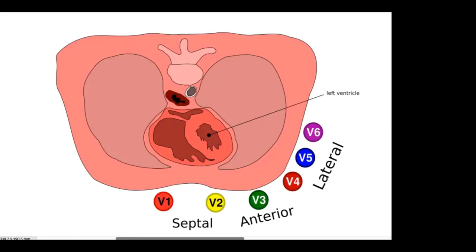Just by taking a keen look at these precordial leads, without cramming or learning it over and over again, you can determine, just by the localization of the pathological QRS complex, where the block is. We proceed.